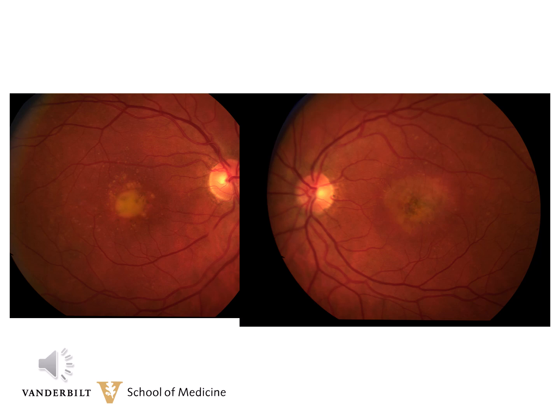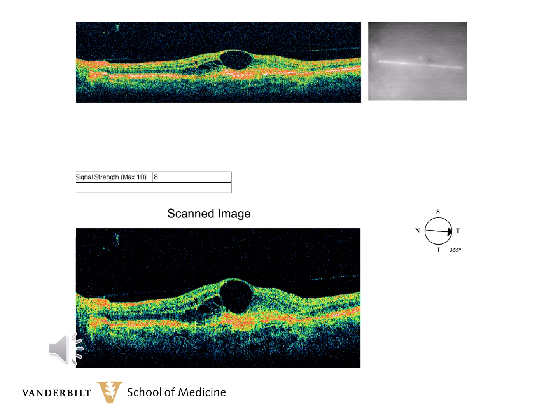1 year later, she came in complaining of more trouble reading. Vision was relatively stable at about 20/50, but the left eye had dropped to 20/400. You can see that the vitelliform lesion in the right eye looks about the same as it did last year, but the left eye is demonstrably different. Her OCT of the left eye also is dramatically different because it shows the neovascular membrane as well as fairly severe intraretinal fluid, which she did not have 1 year previously.